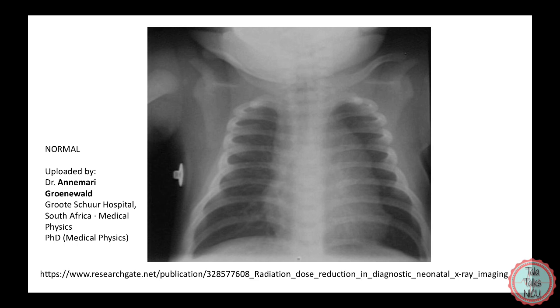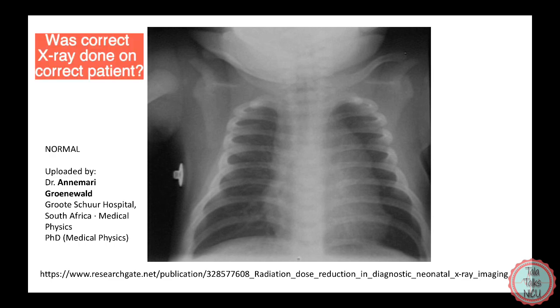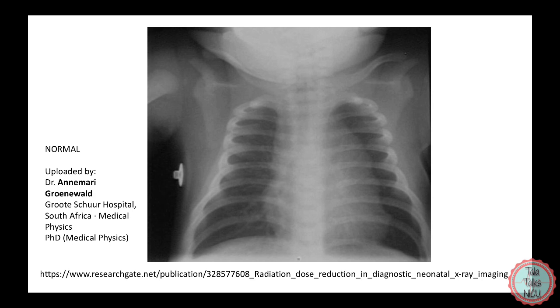The second thing is, look at the quality of the x-ray. Was the correct picture taken of the chest, not of the belly, for example? Was it definitely taken on the right patient? Has the x-ray been labeled appropriately? Are there loads of artifacts on the baby? And what's the exposure like? And we'll talk about that in a second.